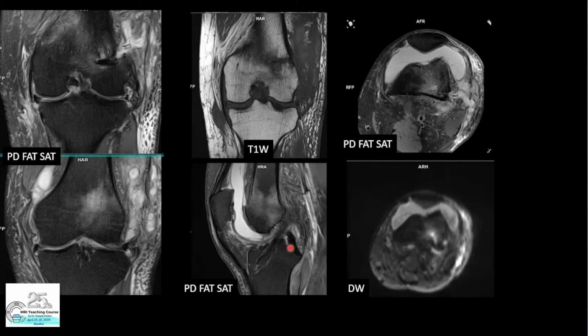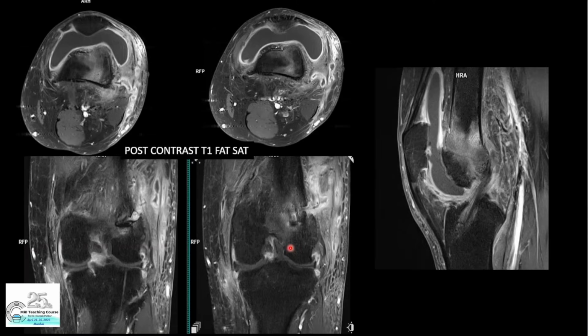So what is the next step in this particular case? What would you do as a radiologist? I think we should be giving contrast. So contrast was also given. The marrow edema is showing abnormal enhancement. There is a lot of synovitis within the joint space, which indicates that there is septic arthritis also, and contrast is providing additional information. The tibial tunnel, which we thought was normal on plain images, is actually showing abnormal contrast enhancement. So we know that even the tibial tunnel is also abnormal.